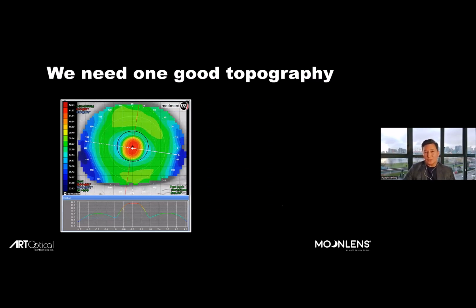So quite simple. Here we have one topography of this eye. Does this look to you like it is an accurate interpretation of a very healthy normal eye? Wouldn't it appear that we have a form of keratoconus or an ultra steep coned central corneal cap? This is not the real shape of this patient's eye. This was just a bad topography. I did a poor job moving the instrument too quick, or the patient wasn't steady enough when I took that capture. There was maybe tear film breakup in the center that was limiting the accuracy.